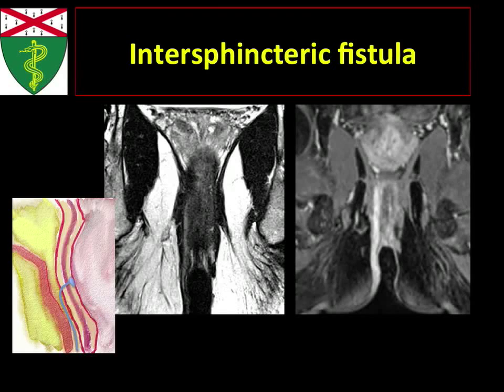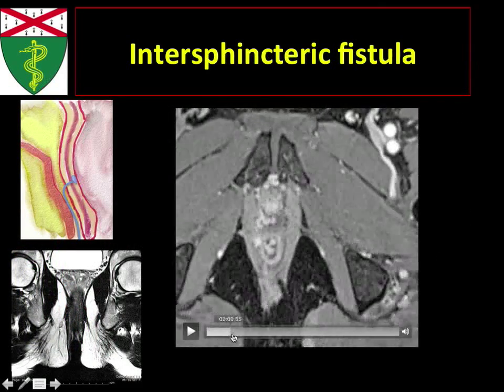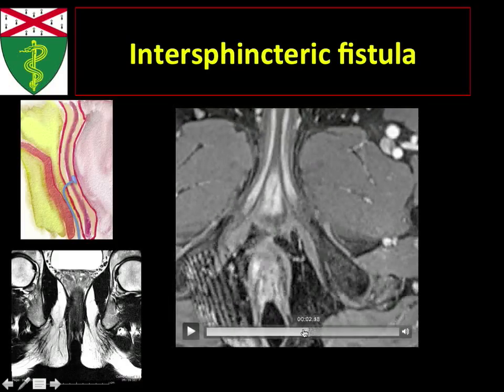Now, if I were to describe it, I could figure out where the clock opening is on the axial images, I think on the next slide, and I can discuss where the distance from the anal verge is, probably from here to here. So that would be one way to describe this fistula. It's right over there. So again, we can look at it now on the axial images post-contrast sequence.